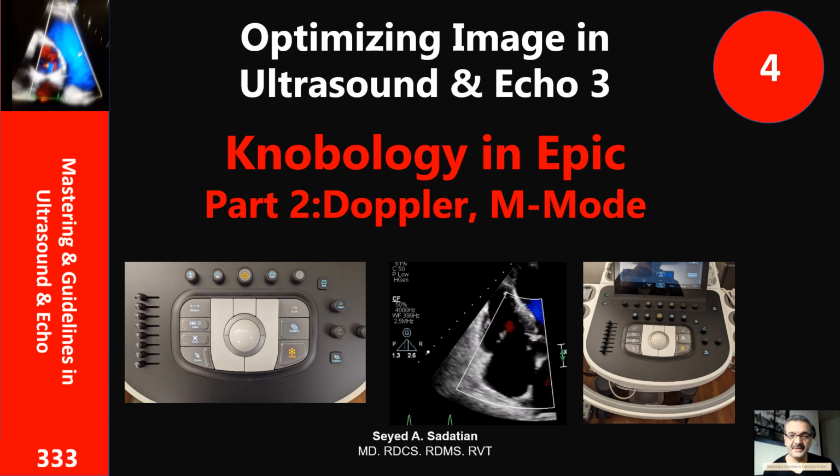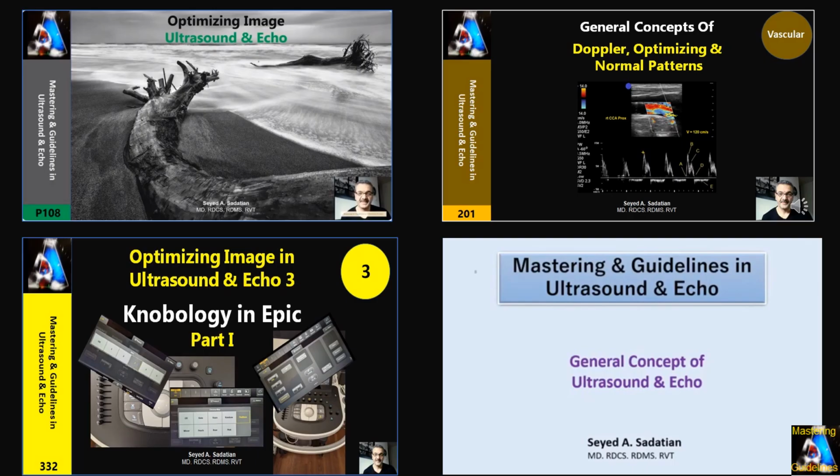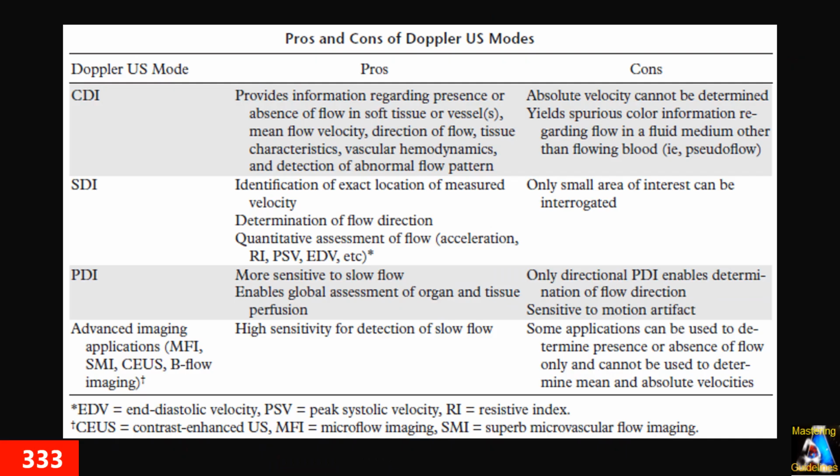Welcome to Mastering Guideline in Ultrasound and Echo. Here we have four other lectures about optimizing and knobology, so don't forget to check them out. Now let's go for color Doppler.